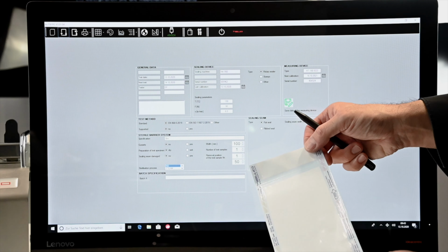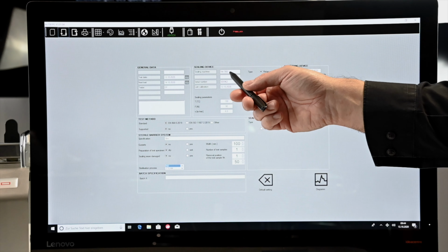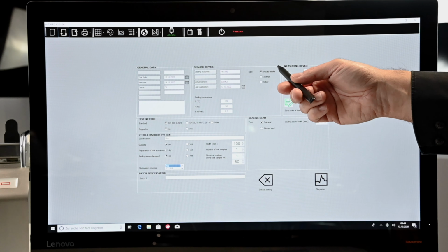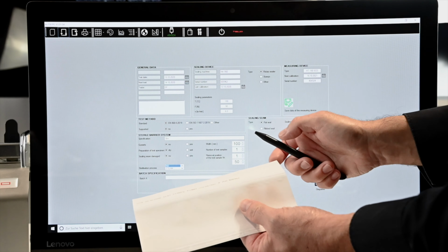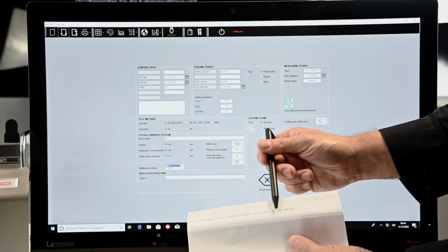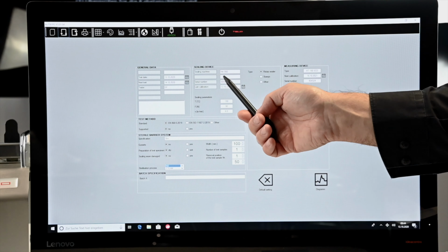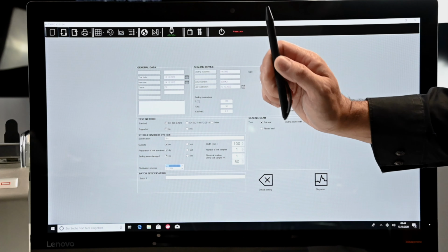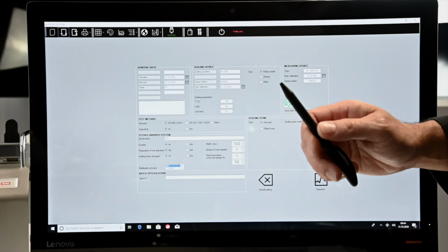In our case, the sealing seam had been created using our hawo HM950, a rotary sealer with serial number 505962, here printed in the so-called seal check mode. Last calibration of this sealing device, we put today's date.